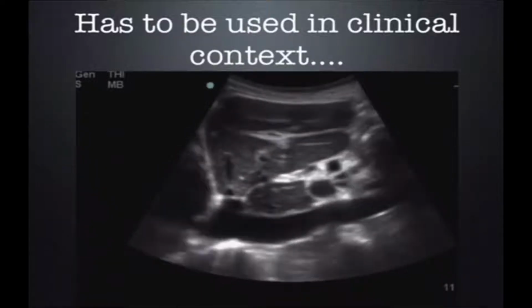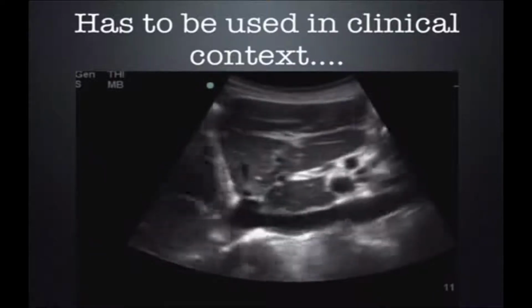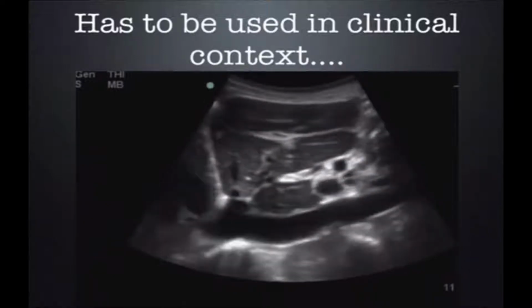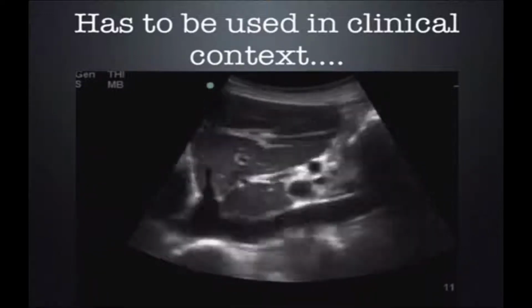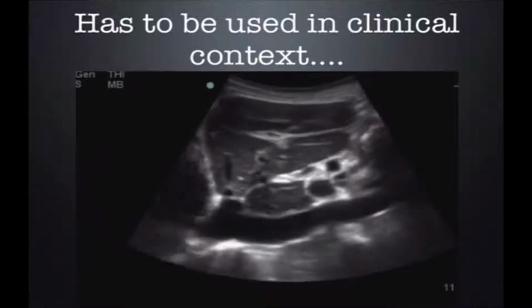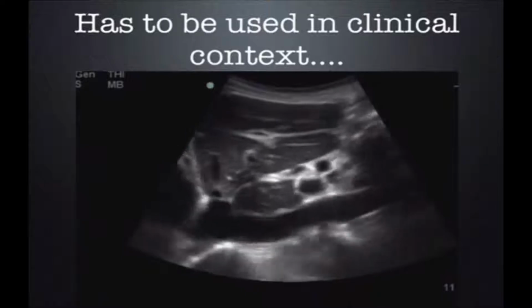The last point I want to make before we move on to the pump is that the respirophasic changes in the IVC diameter really have to be used within the clinical context. Over the years, doing workshops and scanning on models who have absolutely no complaints and are physically fine, we've seen plenty of IVCs that were slit-like and 100% collapsing. Certainly doesn't mean that patient needs to be rushed off to the emergency department and given large volume resuscitation.